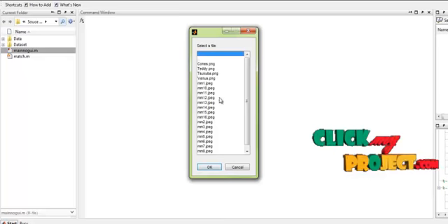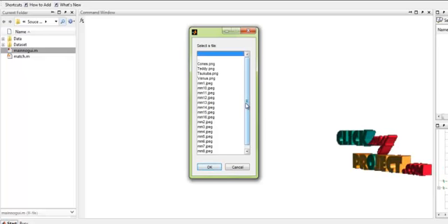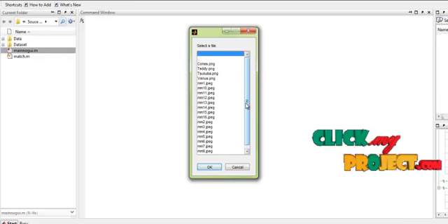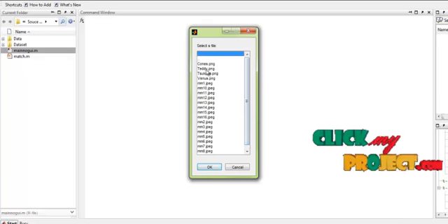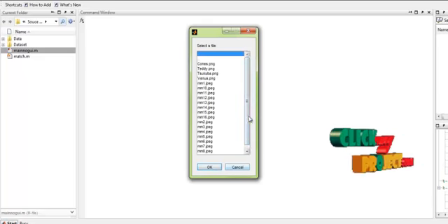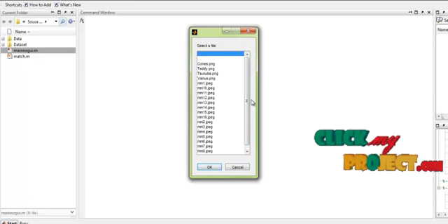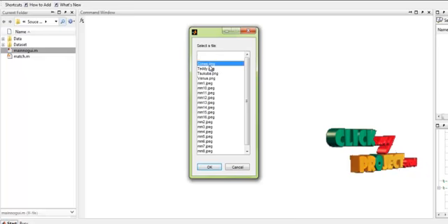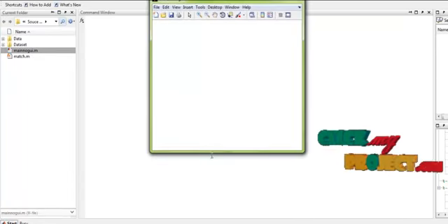First, select any one of the images present in the dataset. We have provided stereo images for the images presented in the datasets. These four were the normal images and these are the mammogram images that we have taken. So we can give any one of the images as the input. We give this image as the input and the process goes on.